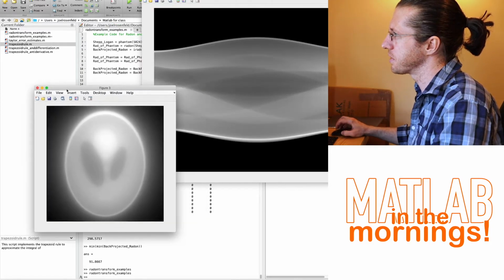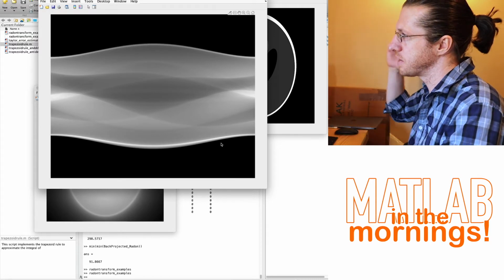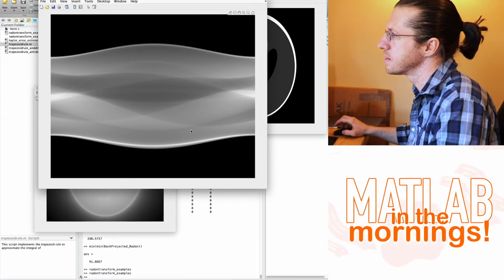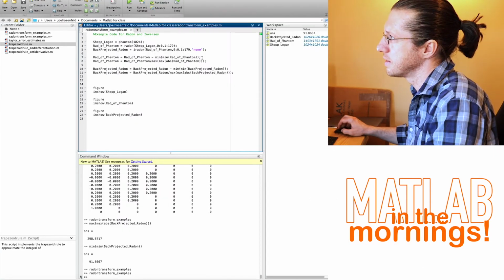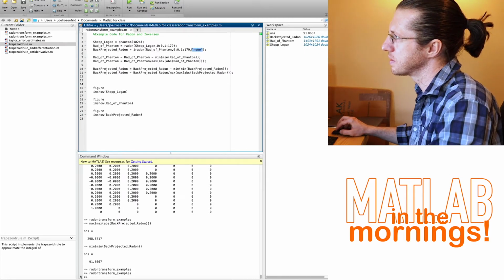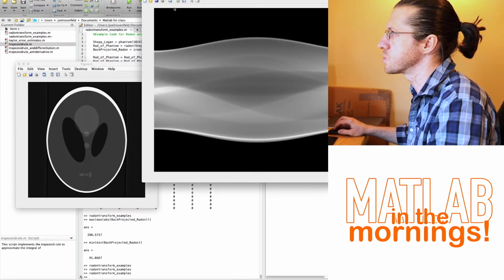There we go. That's the sinogram that I wanted to see. So the last one ended up being way oversaturated. The values got to be way too high, and so it just maxed out where we wanted. This is much better for display. Okay. And then finally, we already saw that taking out the filtering already did better. There, okay. So now we have everything behaving like it should.